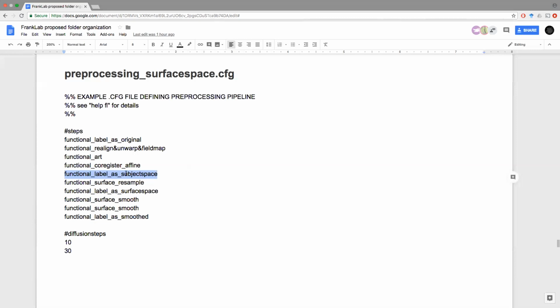So basically, when you resample your data, you get it already in FS average space, and that means that even though your data has been extracted from the actual location of the cortical region for that individual subject, it's still sampled into the same number of vertices across every subject, and in a way that if you represent it on a sphere, it looks like a relatively equal-spaced tessellation, which is actually, there's a nice math behind this.